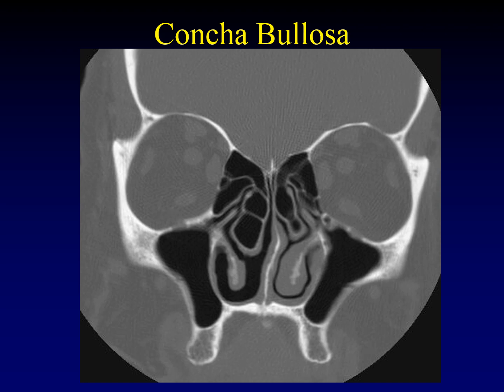First off, note the correct pronunciation of this term. This is concha bullosa. Concha bullosa is pneumatization of the middle turbinate. Sometimes ethmoid air cells occur inside the turbinate itself, and we refer to that as a concha bullosa. These can have any of the spectrum of pathology we associate with other air cells. They can become entrapped and enlarged and infected, but you can see that they substantially widen the middle turbinate.